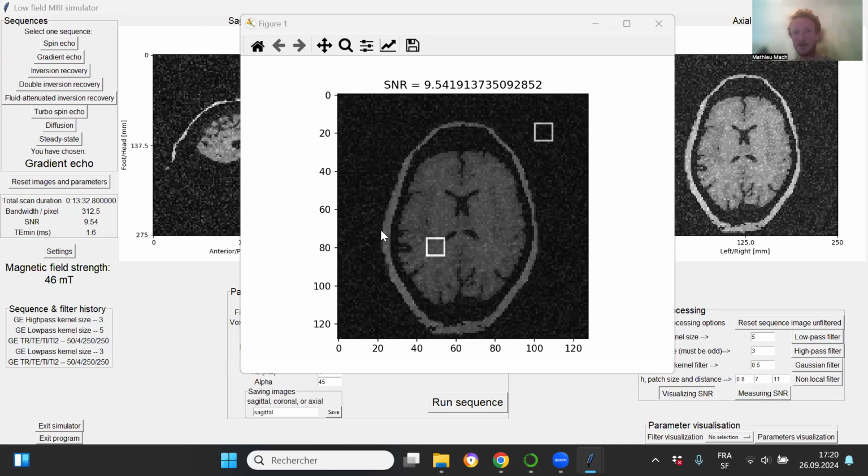Or if that was your question, the idea that we had was, the one that we're using in Leiden for the 7 Tesla had this layout, and it was from Philips, if I remember correctly. And we just wanted to make it, for example, if a doctor or clinician is using this simulator, as familiar as possible with some of the other classical MRI dashboards that they use. So if that was your question, let me know, or if I didn't answer it, or if you'd like more detail, please let me know.